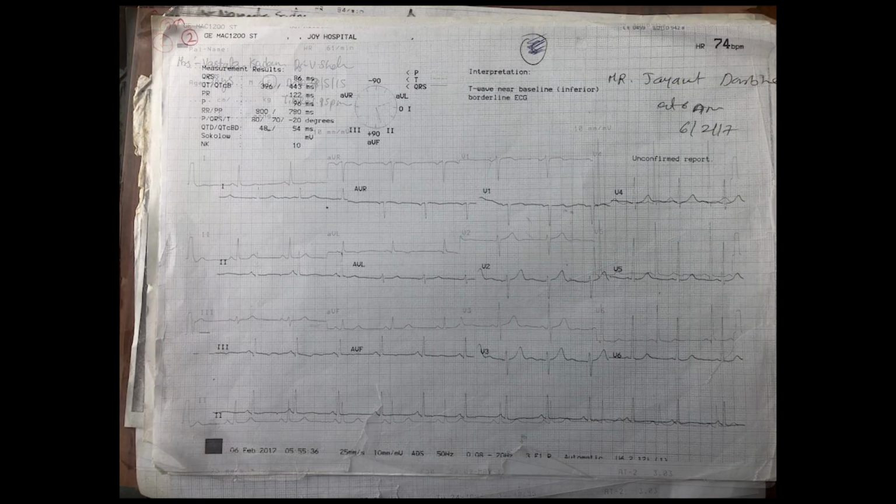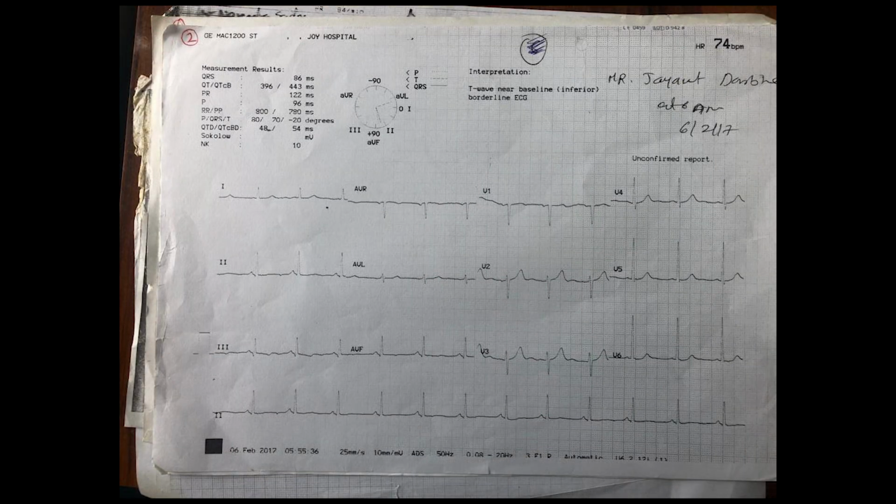That's all. Calculation of axis in image 2. See all the images. Lead 1, lead 2, lead 3 are predominantly positive, AVR predominantly negative, AVL positive plus negative, so it is equivocal. AVF is predominantly positive. So the most equivocal lead, as we already said, is lead AVL. So the axis has to be perpendicular to lead AVL.